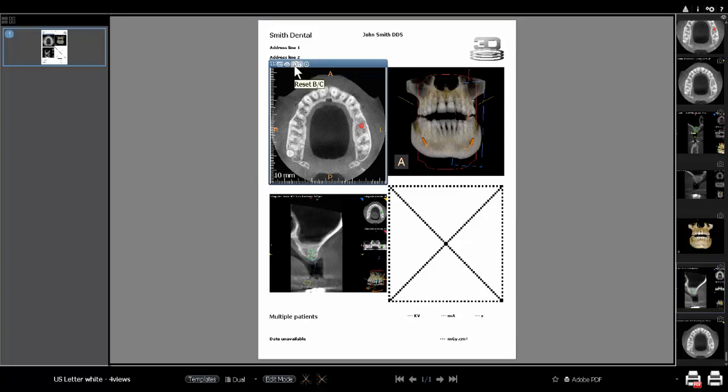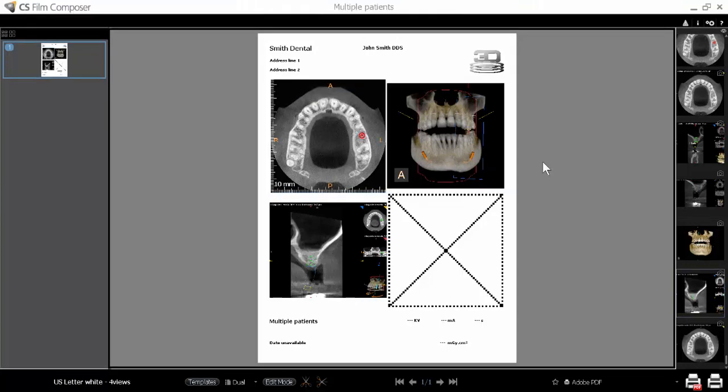You may reset the brightness and contrast of the image back to the default, or you may launch the image selector for multi-slice images. You may also change the brightness or contrast of an image by left-clicking on the image and moving your mouse up or down to change the contrast, or left clicking and moving your mouse left or right to change the brightness. Remember, brightness and contrast may be reset back to the original settings with the Reset Brightness and Contrast button.